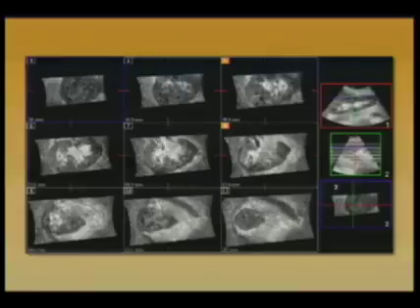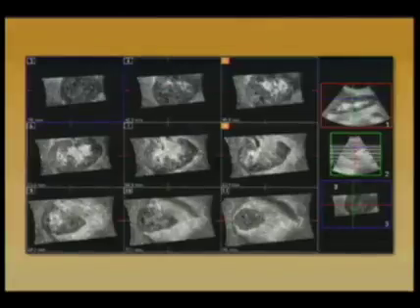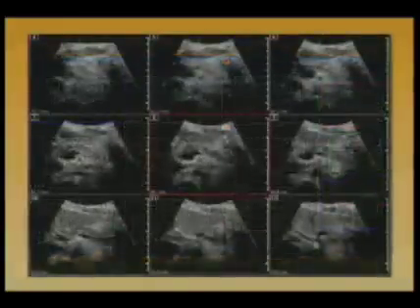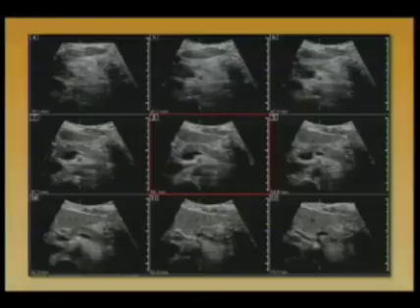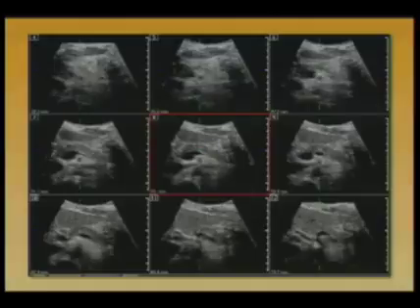Here's an example of a kidney with multiple slices done by slicing a 3D volume. And again, the question is, is having 10 slices of a kidney in one particular imaging plane too much for somebody to look at? Here's another example of a pancreas. We're typically used to looking at maybe 3 or 4 images or clips of the pancreas. If you instead create 10 or 50 or 100 static images of the pancreas, I think most radiologists would say that that is too much.